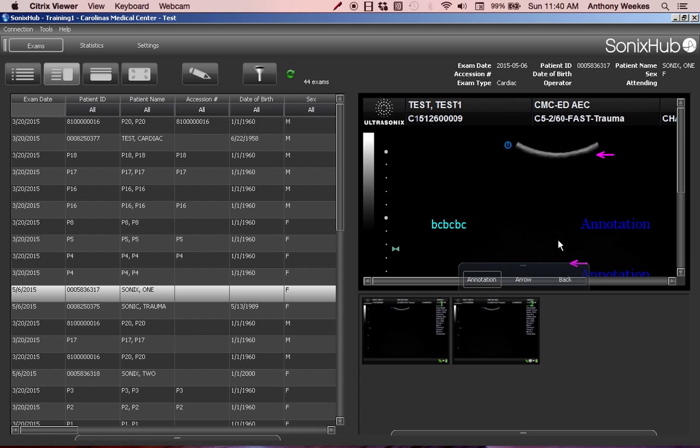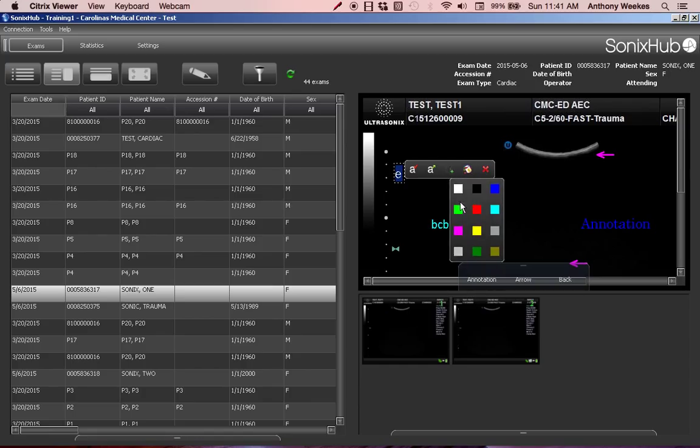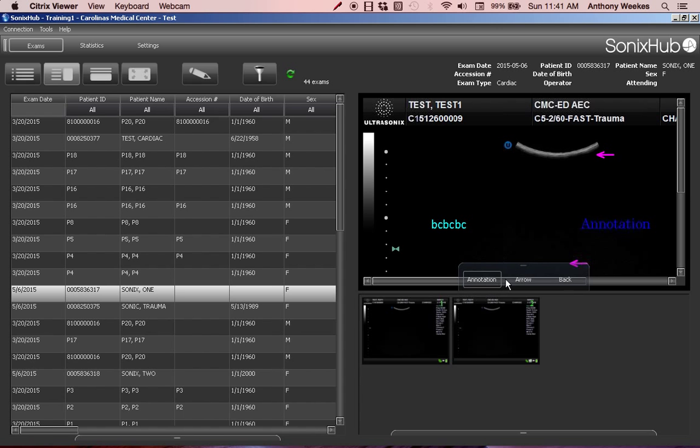You can also annotate yolk sac, adjust what's inside there, and put anything that seems appropriate for medical documentation. That probably isn't. You can change the color. Right click, you have the option to change the color. Change it right here and delete. Put backgrounds, look on, then get rid of it. So those are some of the options that you have.